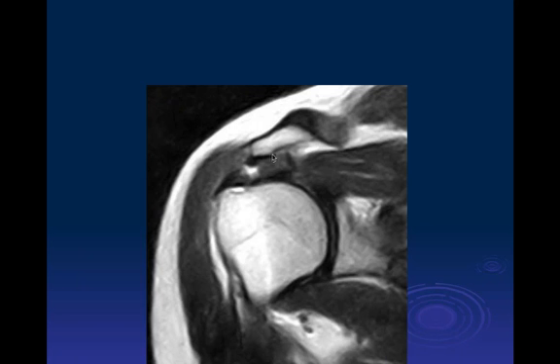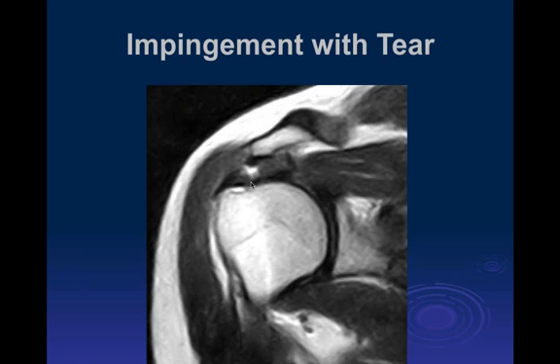There's a little osteophyte here with some eburnation. So this goes to abnormal trauma on the acromion process. And then you're right, this is a partial tear, probably greater than 50% thickness, primarily involving the bursal side surface of the tendon. And this is another case of acromial impingement with secondary partial tearing of the supraspinatus tendon.